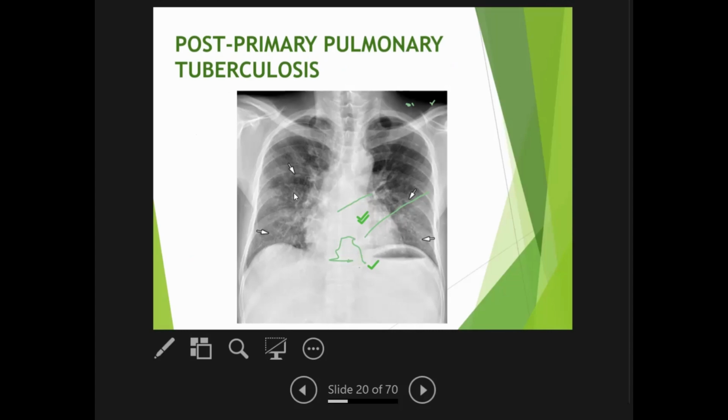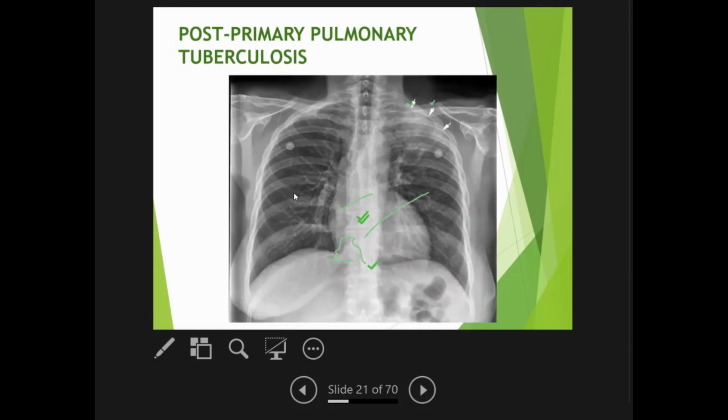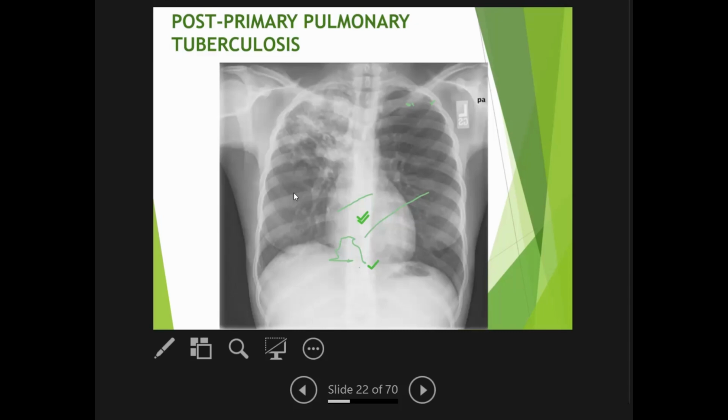With more advanced disease, you might see more fibrotic or linear bands all over the chest. Later you can see pleural thickening. These arrows show pleural thickening with an upper lobe consolidated-like appearance, due to a little bit of fibrosis and pleural thickening. In a more advanced case with fibrosis, this is the left hilum, in normal position. This is the right hilum, which is elevated, and you can see the linear bands and small cystic areas with thickened pleura, due to fibrosis.